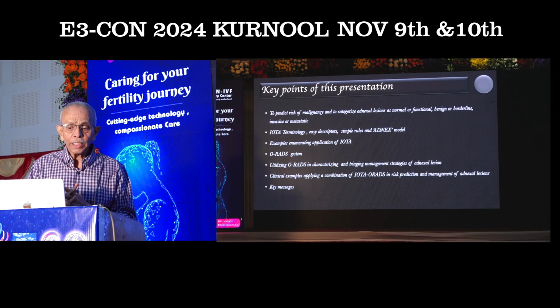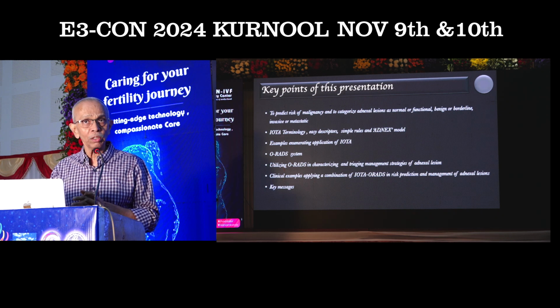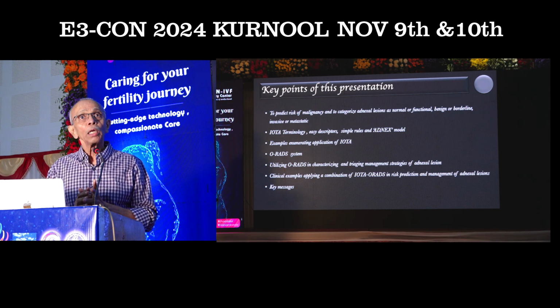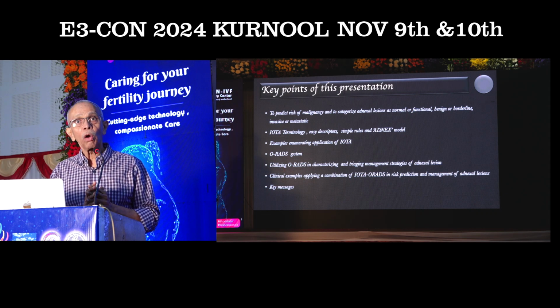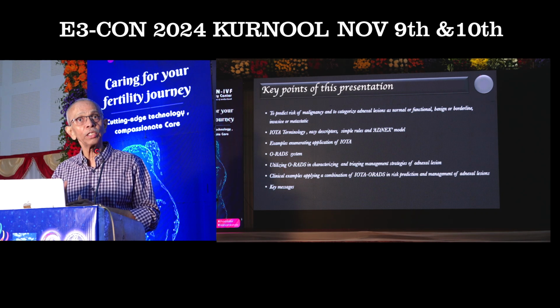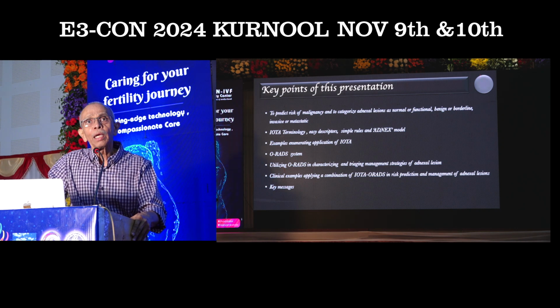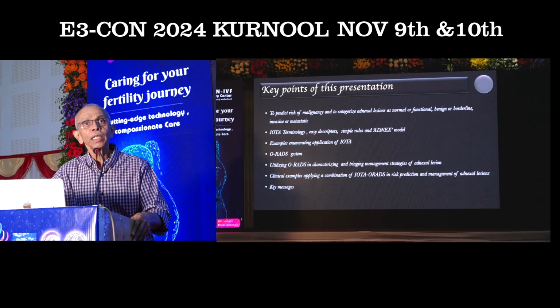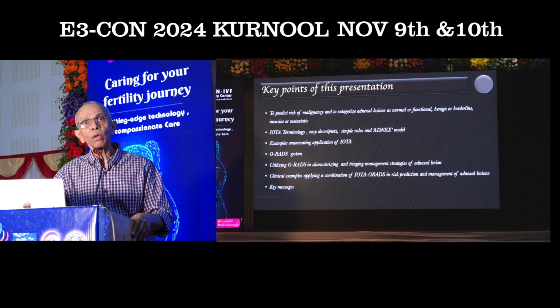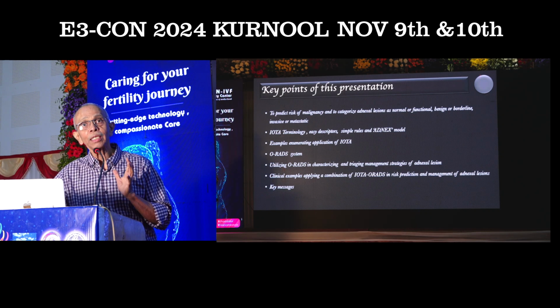Today's presentation is basically to predict the risk of malignancy. That is one of the most important things that I am going to focus upon. The aim is to categorize these adnexal lesions as benign or functional lesions, or malignant, invasive or metastatic lesions. In order to achieve that, I would like to depend upon the IOTA classification. This IOTA group has come forward with certain defined terms and measurements that can be used in evaluating various adnexal lesions. That is one.